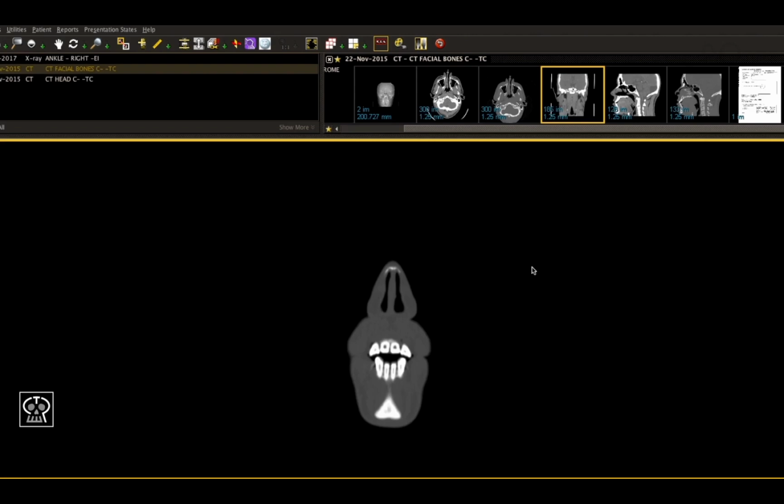As we look at our scan, you'll realize that we've already examined the areas of a NOE fracture. When looking at a CT facial bones for fractures, it's important to take a stepwise approach that we've been teaching in this module and in this course, rather than looking for specific fractures like an NOE fracture or a ZMC fracture. Rather, you'll look for fractures and note them in specific areas that will lead you to the conclusion that an NOE fracture has occurred or that pattern of fracture is present.